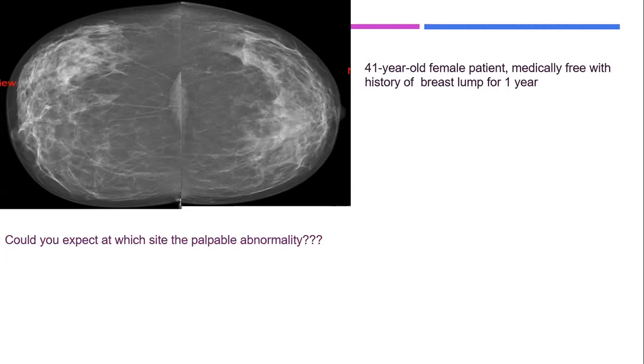Abundant fat, even you might see it with less breast density, with more intervening fat, okay? But due to the heterogeneity and complexity of the underlying breast parenchyma, the appreciation of underlying lesions will be difficult. This patient has an abnormality in the right breast.